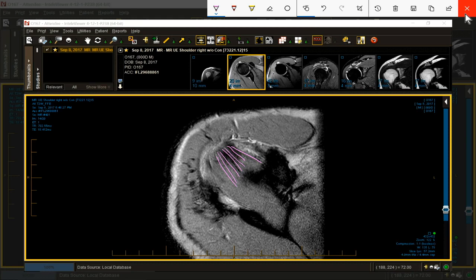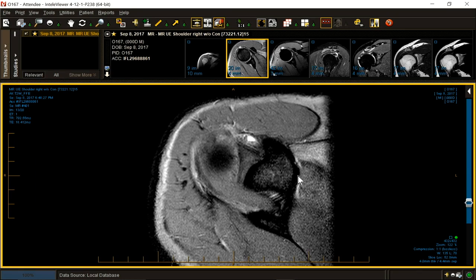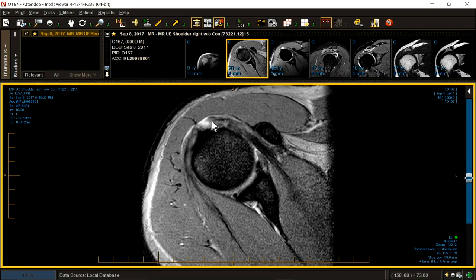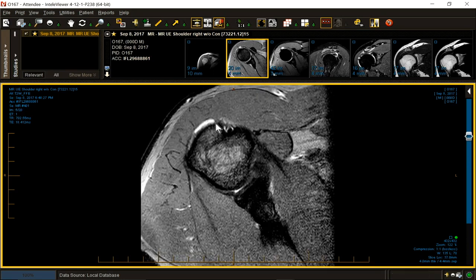There's some fibers present here. Let's go down. We're high. Let's go low. Now, as we get a little lower anterolaterally, the rotator cuff fibers demonstrate a defect, don't they? And perhaps another defect, although there's a little pulsation nearby. The defect's still present.